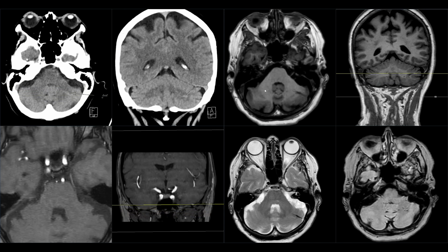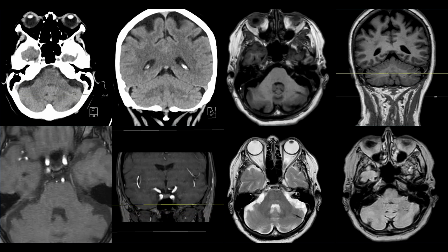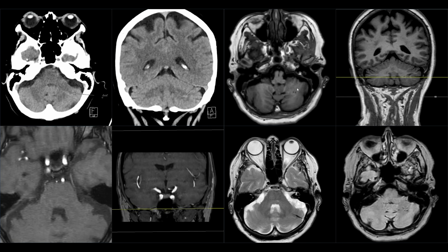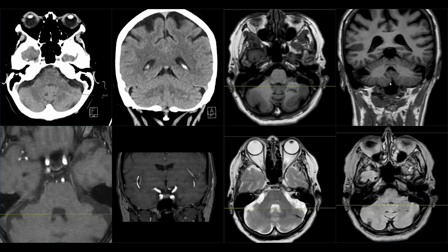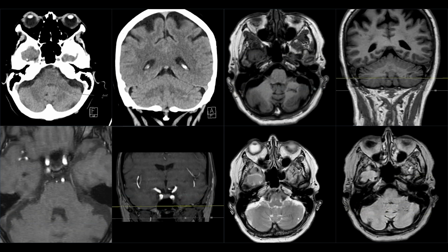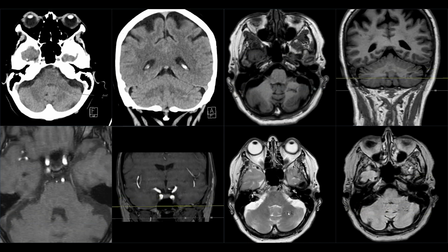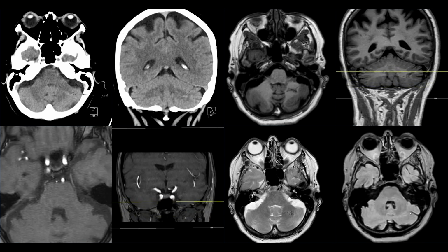We performed MR investigation that has confirmed a tubular structure here on T1 without contrast, with branching vessels like the caput medusa mostly described. And we have seen a low signal in this structure on the T2 weighted sequence and also on the FLAIR sequence.